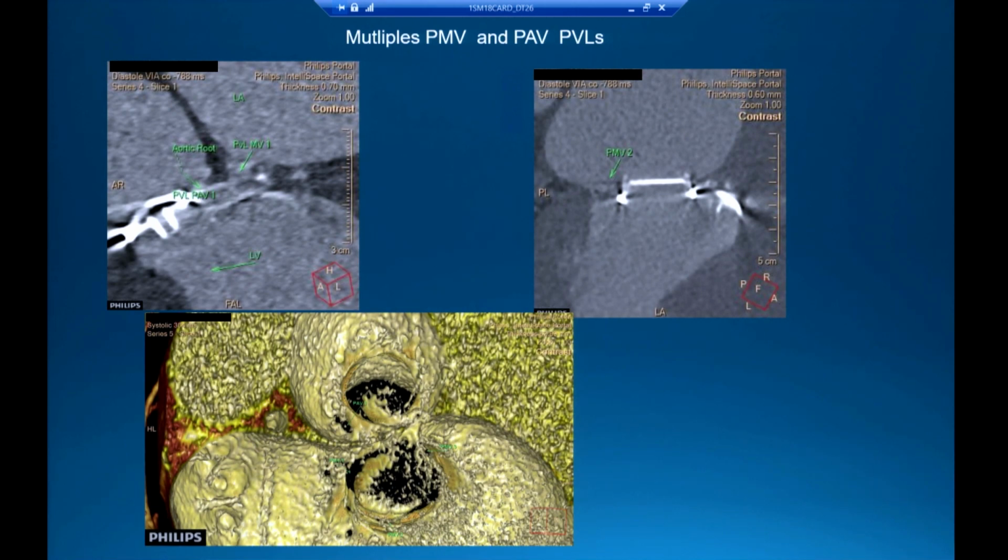So you could be thinking that you're seeing a defect. So you really need to have echo, especially color Doppler. You always have to go back and look at your echo images, and make sure the defect you're seeing has color Doppler going through, because color Doppler, no question, is the most sensitive technique to detect any regurgitation or any abnormal flow. So wherever you see it in the CT, unless you see a big hole like we saw earlier, you always have to confirm it.